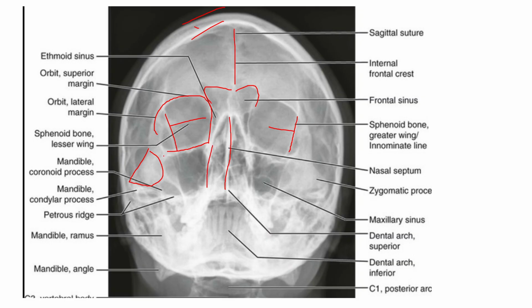So you see this pyramidal sinus, this sinus is maxillary sinus. So basically base is in relation to the lateral wall of nose, roof in relation to the orbit, floor of orbit, and laterally you see zygomatic bone is coming in its relation. The floor is upper alveolar arch, okay. Now this sinus also drains into lateral wall of nose. Here also this is your maxillary sinus, the zygomatic bone here seen. Now what about this bone which goes from here like this, this is your petrous bone. This is your petrous bone.